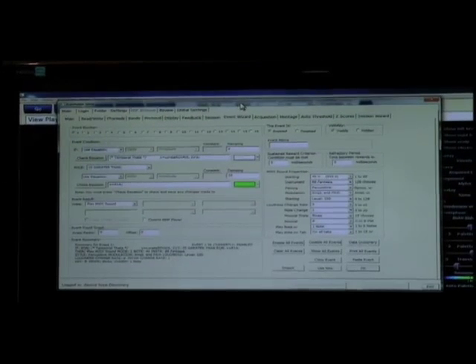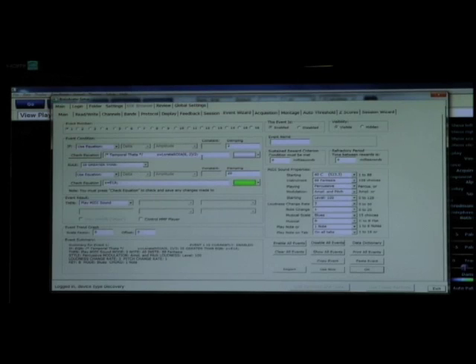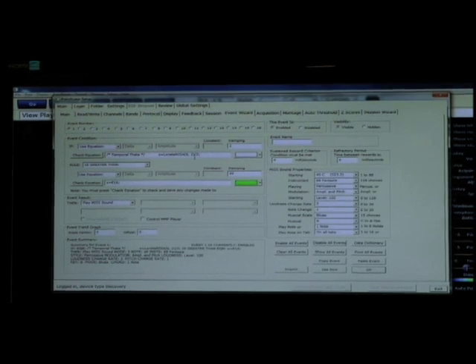This particular protocol, as are many of our protocols, is set up for LORETA region of interest work. For example, this one shows an equation that simply says x equals LORETA ROIA, which means region of interest amplitude. And it has then a 6 and then a 2.